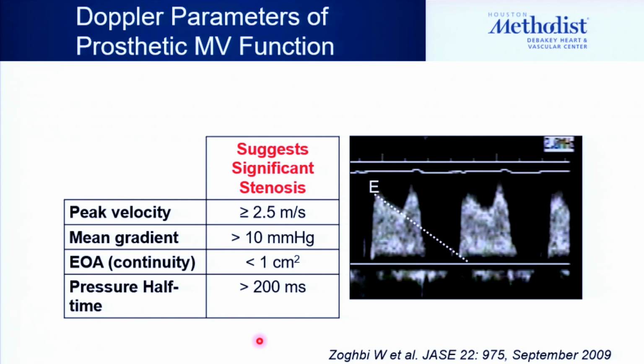And these are some of the parameters that would suggest significant stenosis. And we're talking significant. In between, you also have to compare previous hemodynamics for that particular valve, because a small valve in a mitral position could be a 27 millimeter valve. Normally, it should be a 31 to 33 millimeter valve. Just imagine a 25 millimeter valve, which is not infrequent in somebody who has calcifications in the annulus. So your gradient at baseline is high. You need to know those hemodynamics before.